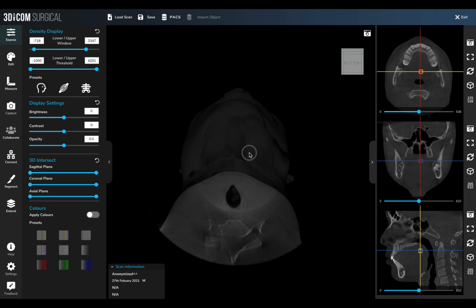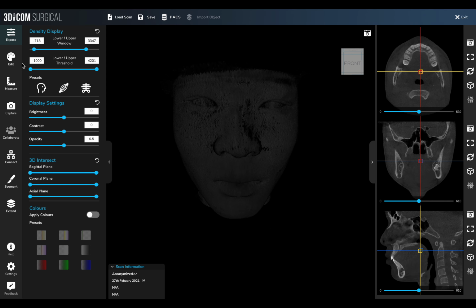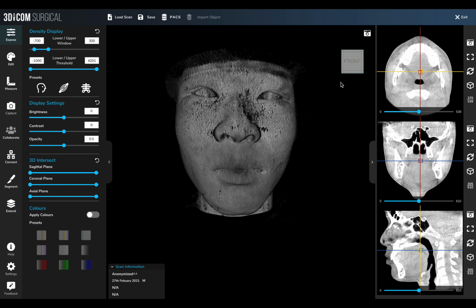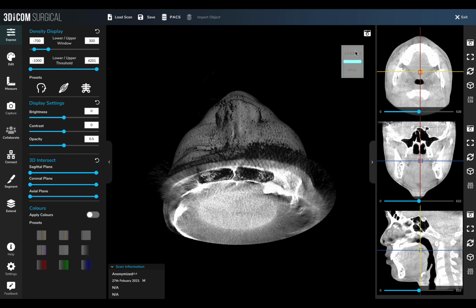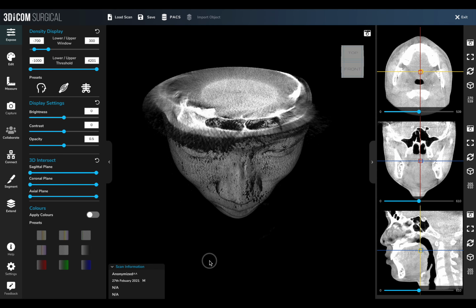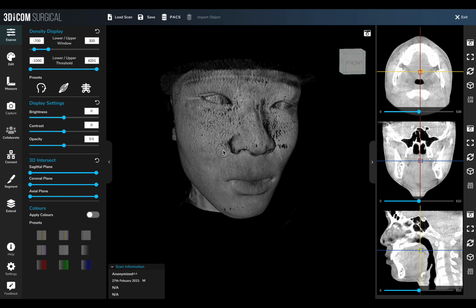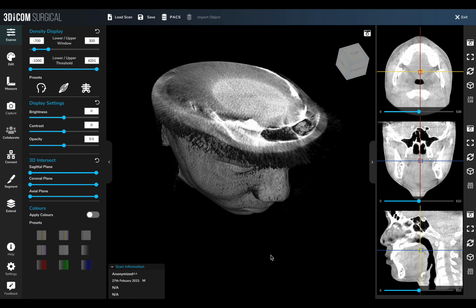So the very first thing, bringing this up, is when we go to the presets here, one is the actual location of the nav cube here. So the navigation cube really needs to be next to the camera up here rather than sitting below it. Additionally, when you click on this upper corner, it inverts the camera, whereas what you really should have is the ability to go up to here. Again, when you click this, it inverts the camera, whereas it should be showing effectively this view here.